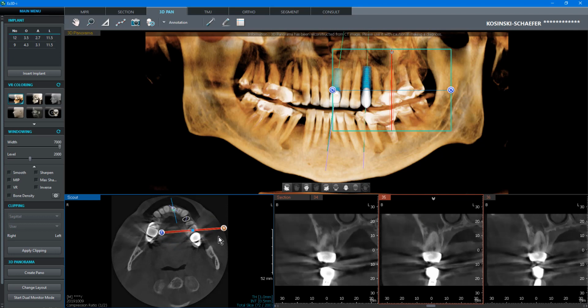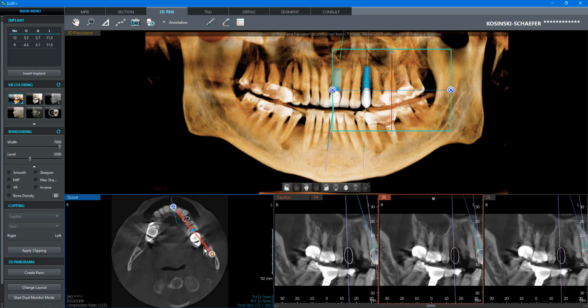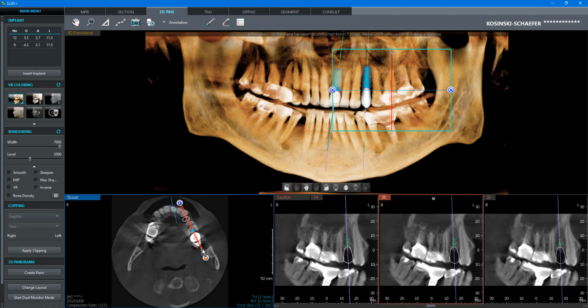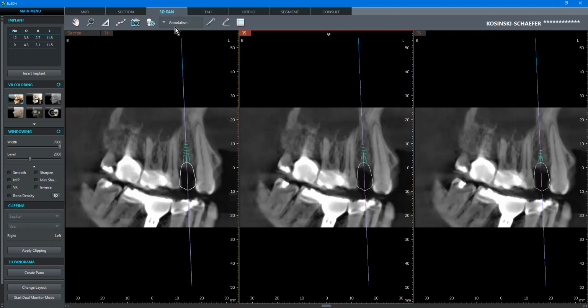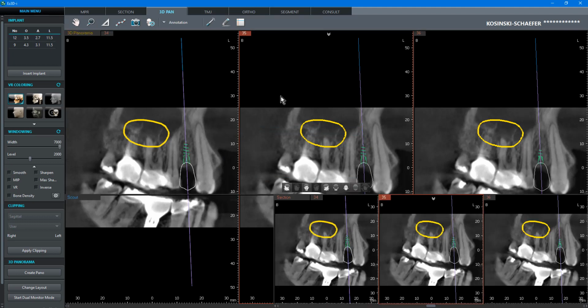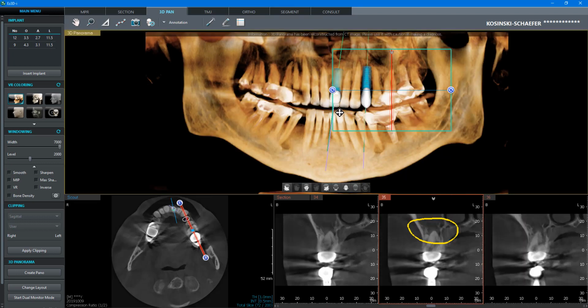We can rotate our view to generate a sagittal view of our anatomy. Select the Enter key on the keyboard to maximize our workspace. Go back to our pencil in the annotation section. Left click and draw a circle around that artifact as well. And then left click on the camera to document it. Select the Enter key to go back to our previous layout.